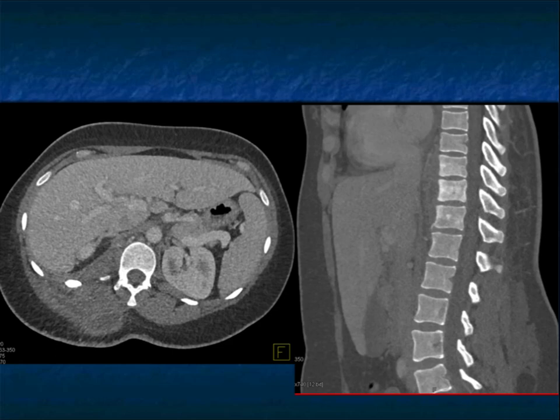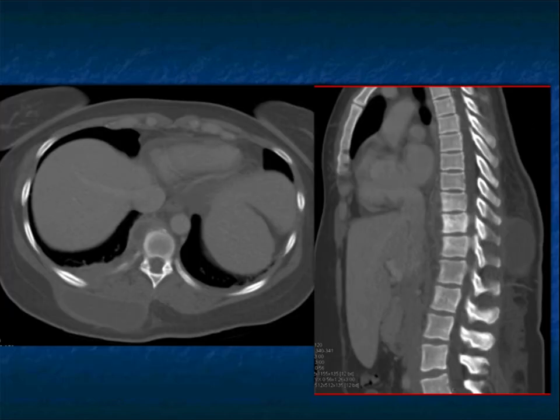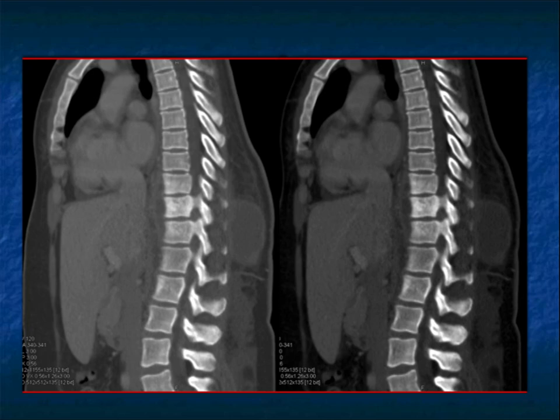When you look at the lateral view, which of course is critical, you can see some sclerotic changes in bone. There's no gross destruction or collapse or discitis at this point, but there are multiple vertebral bodies that show sclerotic changes present consistent with the patient's path-proven diagnosis of tuberculosis. As you go to the bone windows and widen the windows a bit with 3D imaging, you really can appreciate the bony changes. At times, you don't always appreciate them on the axial view. The sagittal view, you really see them better because you look at the normal and the abnormal vertebral bodies. So even when there's subtle sclerosis, it's much more obvious when you're looking at it.